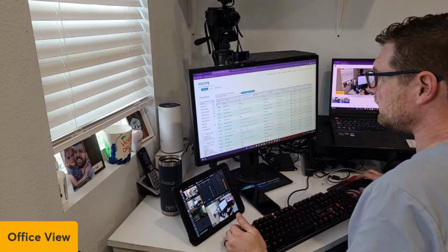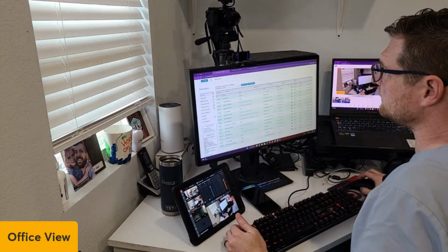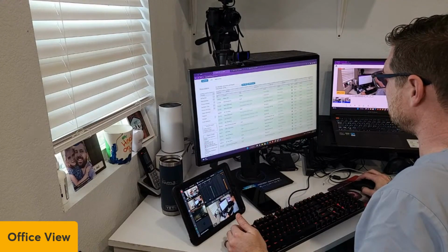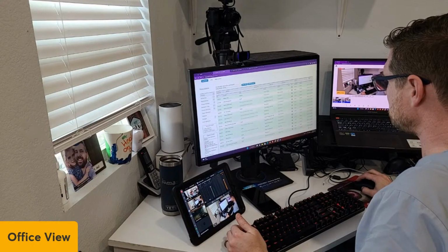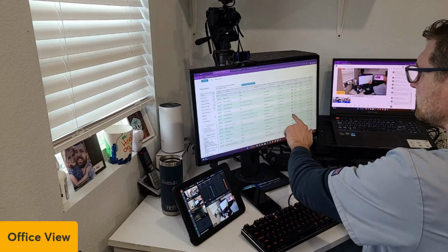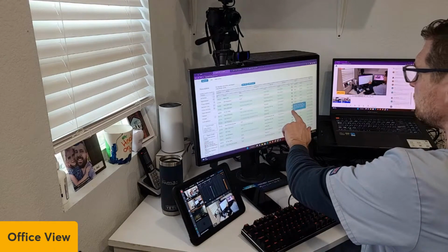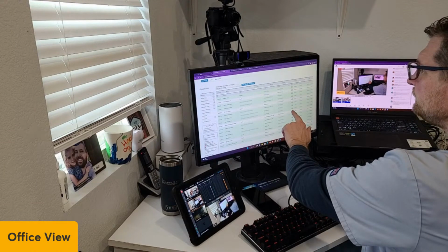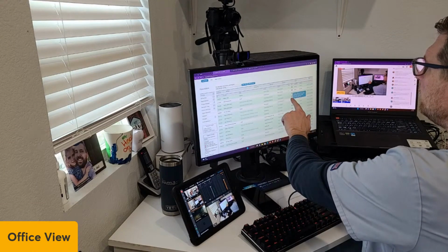Let's go and you can hover over the little teeth icon, and it's going to tell you what each of these are, so I can kind of get an idea of what it is before I check it in.